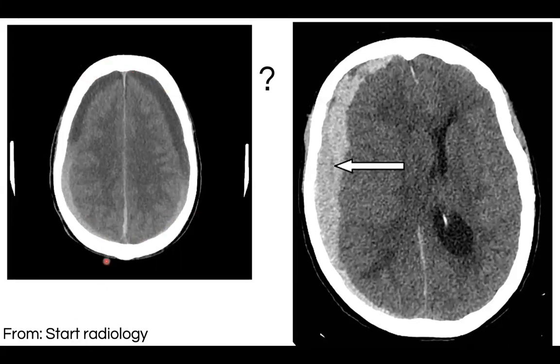Okay, so can anyone tell me what this is showing? So subdural hematoma, yes, but which side is it on? Okay, this is a trick question. They're bilateral subdural hematomas, yeah? So again, we start with the name of the patient, their date of birth, a bit of background history. So if I said this person was involved in a head-on motor collision, and they were involved in this 4 weeks ago. So what this is actually showing is an acute on chronic subdural hematoma, which is bilateral.